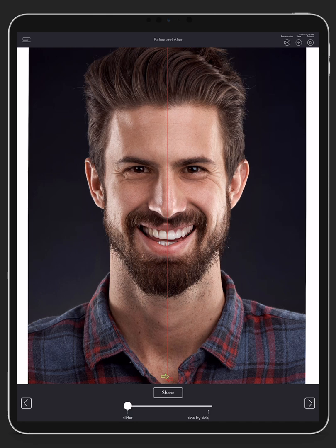So we have 4 designs done automatically: round shapes, open embrasures, closed round shapes, closed embrasures, triangular shapes with square embrasures, and a mixed design. We communicate with the patient. We find out what kind of smile, what kind of shape the patient likes. We continue, we select this kind of design, we continue, we discuss the dominance of the smile, and that's the result. Patient is motivated.